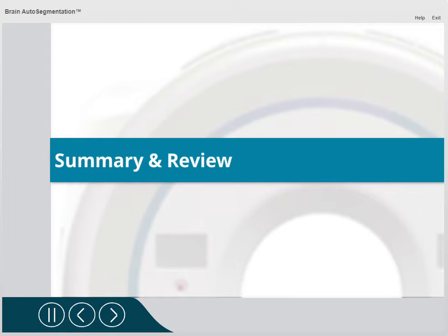We believe it will provide physicians with the ability to evaluate dose statistics for more critical brain structures, particularly functional regions within the brain. If these VOIs were requested and had to be drawn manually, it would be very time-consuming, if possible at all.